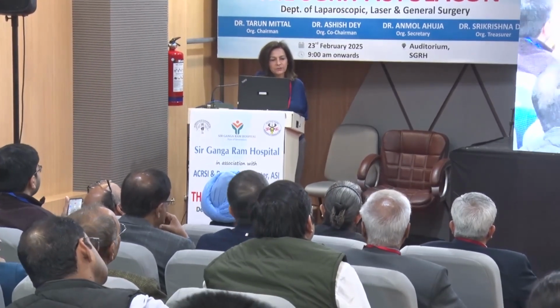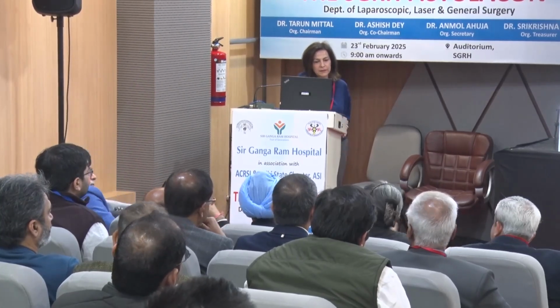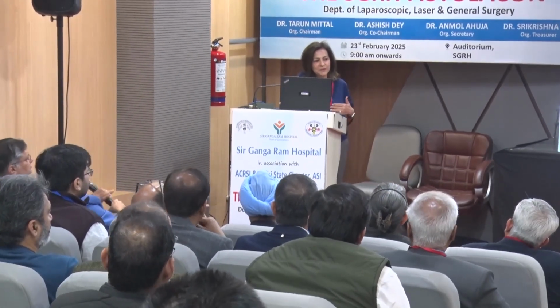So like I told you, it's not one picture, but if you see the coronal, I think that is what you're used to looking at. And you will have to look at the fat suppressed images if you're looking for a patent fistula. So that would be the thing. And about surprises, we've seen lots of surprises. We've seen clinically, you've written it's a simple intersphincteric and we find it complex. So I mean, I'm a radiologist, but I would definitely advise that you should, if it's available and the cost and the time is available, I think you should get an MR because we've seen lots of surprises. We've even seen tumors which are now fistulating, which were not diagnosed clinically.